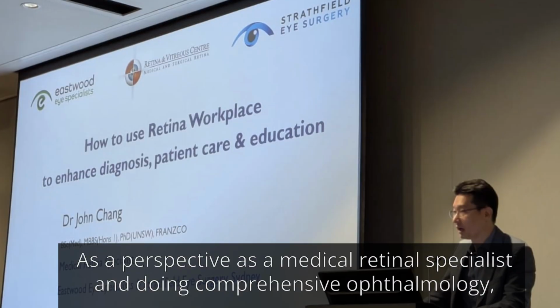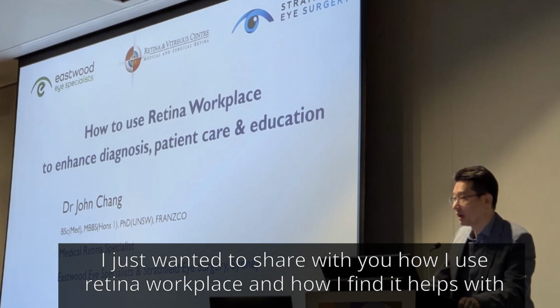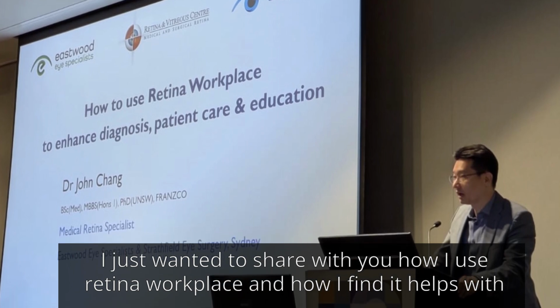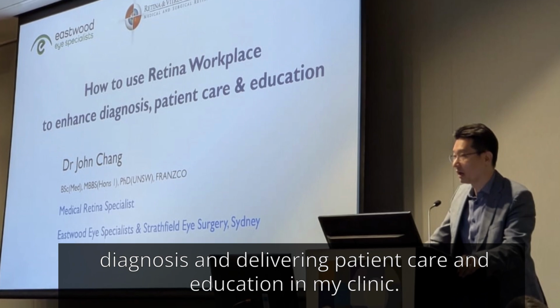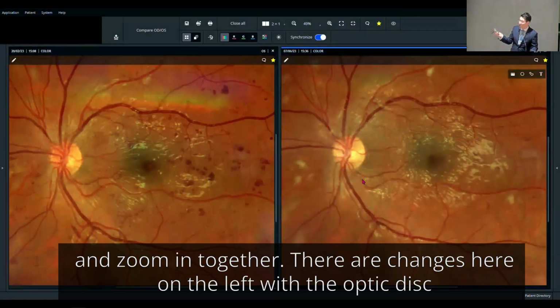As a medical retina specialist doing comprehensive ophthalmology, I just want to share with you how I use Retina Workplace and how I find it helps with diagnosis and delivering patient care and education in my clinic. And then I was concerned about, as we zoom in, you can synchronize the images and zoom in together.